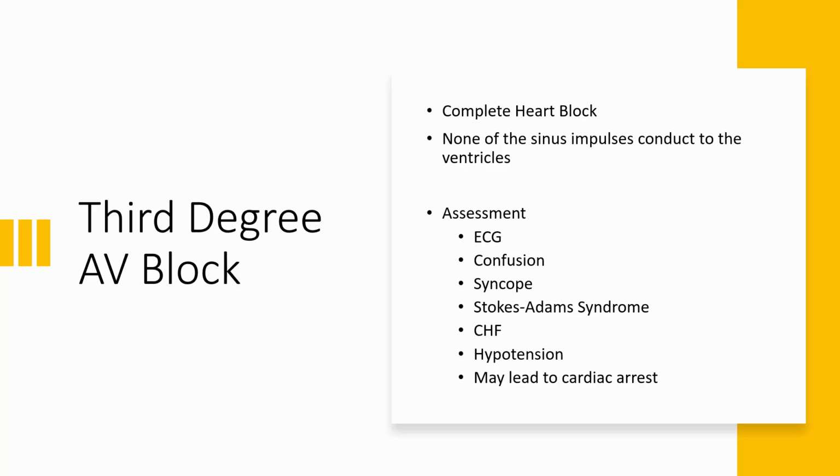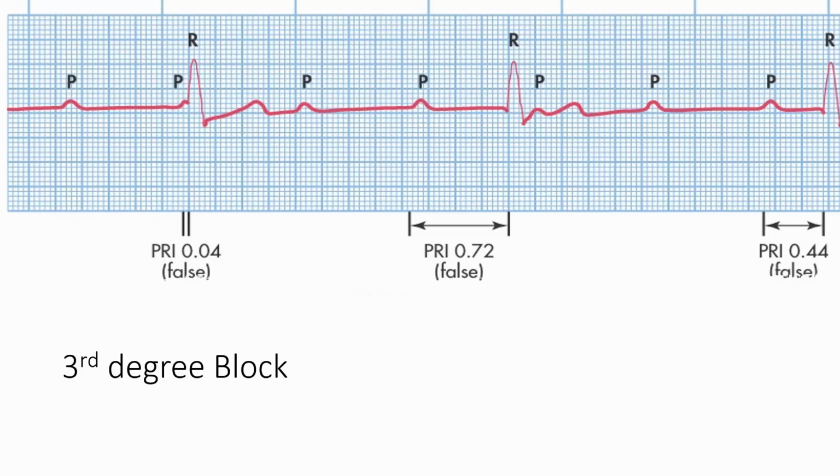has to communicate. The ventricles of our heart have to put the blood out, and the atria has to tell them what to do. So it is essential in a third-degree heart block that you recognize it and you act quickly. When you're doing the 5-step method on a third-degree heart block, the first thing you look at is the rate.